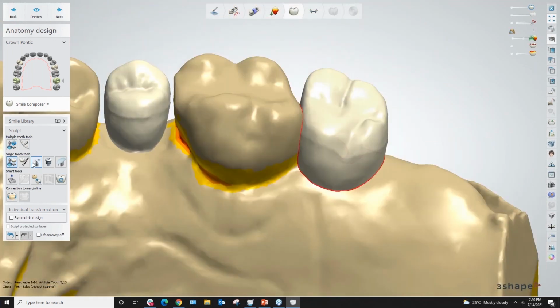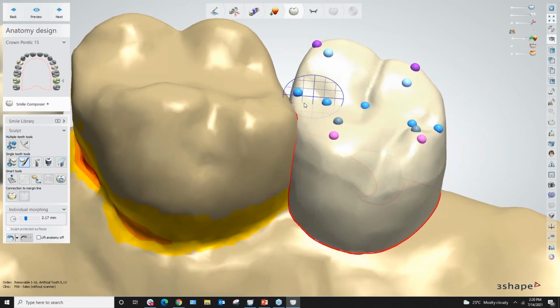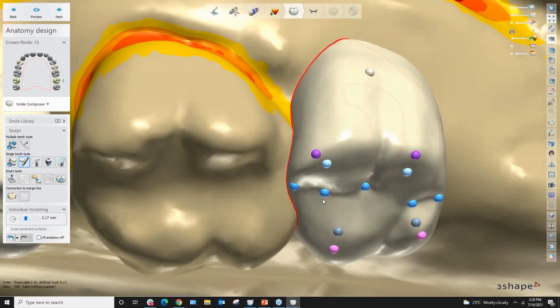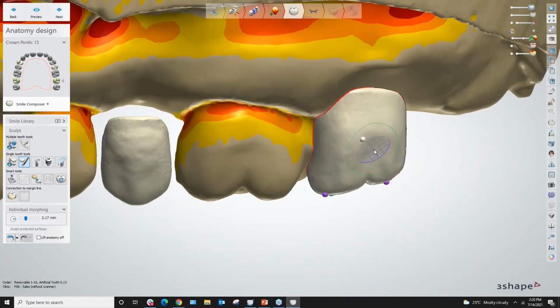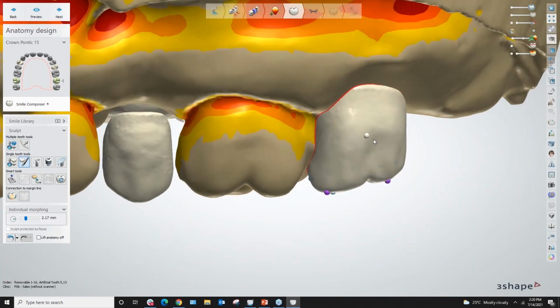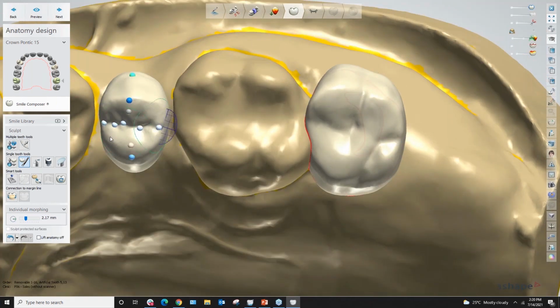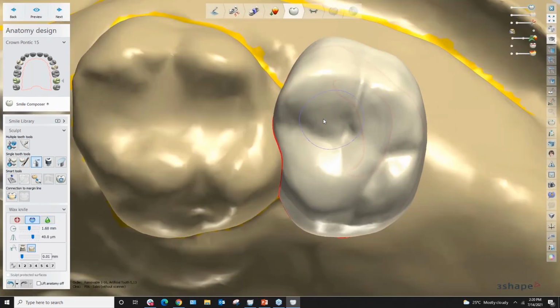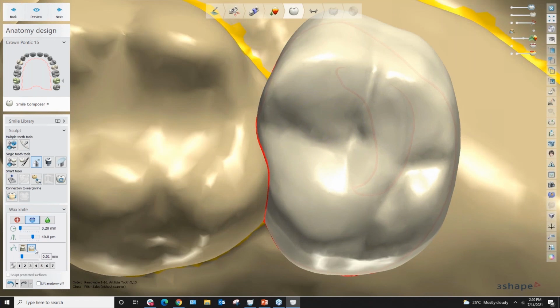And have in mind that because these ones are crown pontics, you can actually freestyle your design and do as you please, whatever your taste is for design on the crown pontics. So you can still use the traditional reductions, and you can go ahead and maximize your design capabilities, right?